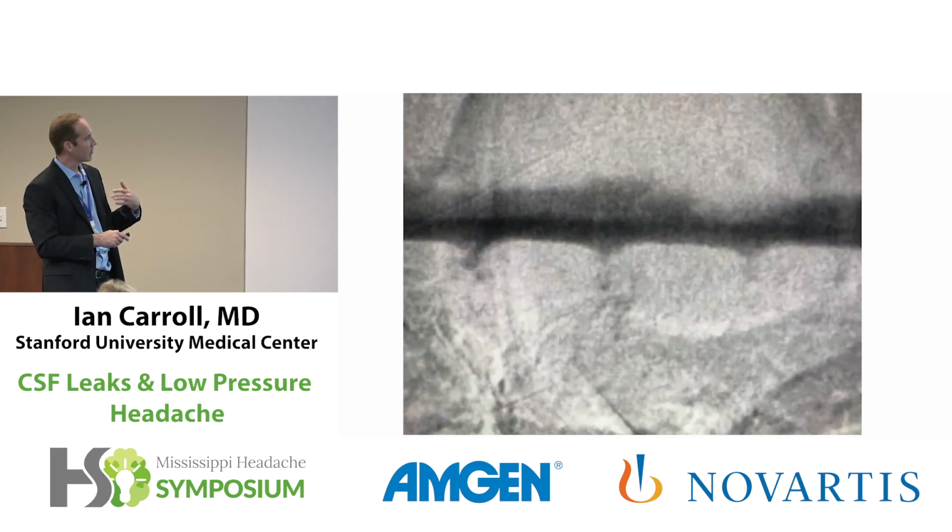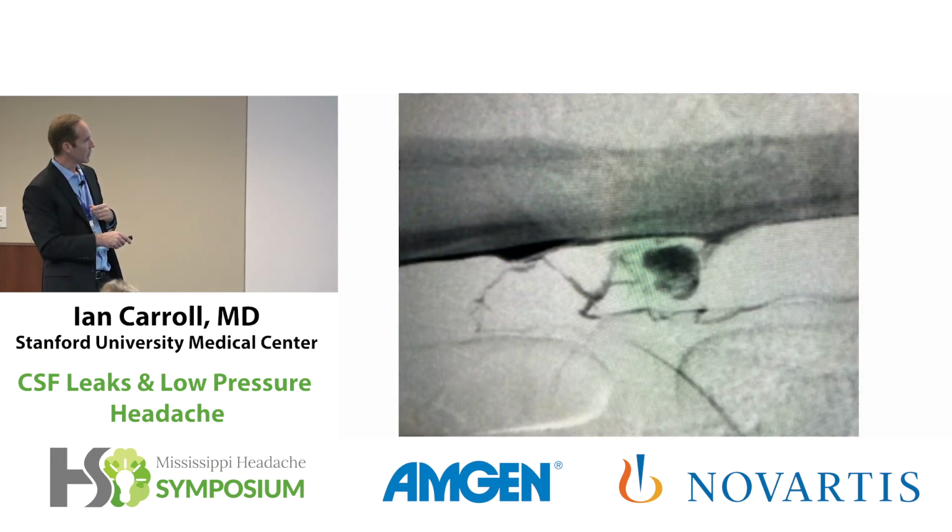This is someone who got a myelogram while they're in the lateral decubitus position so that the hyperdense, undiluted contrast can pool on the side. And in fact, this stuff here, this kind of hazy stuff, is a CSF venous fistula, is some of the contrast escaping. This is someone else who has a little more of a brisk leak into the veins, and you can see the perineural cyst here, and then this stringy, strandy stuff. That's contrast escaping into the veins.